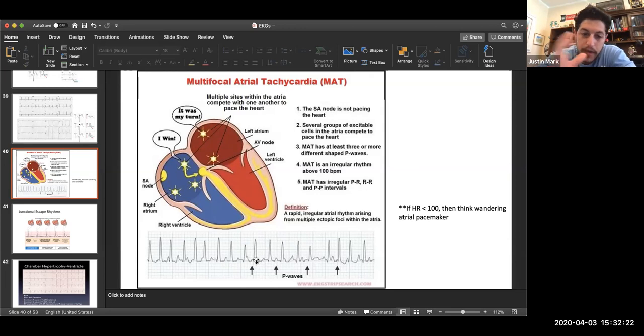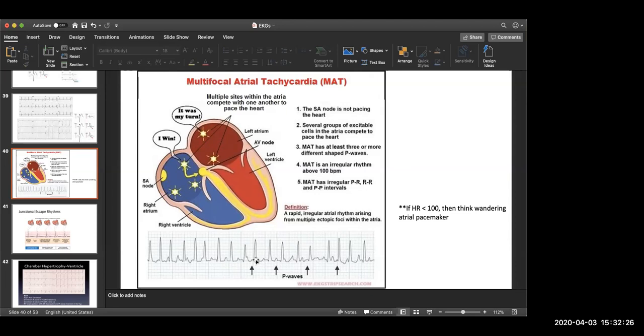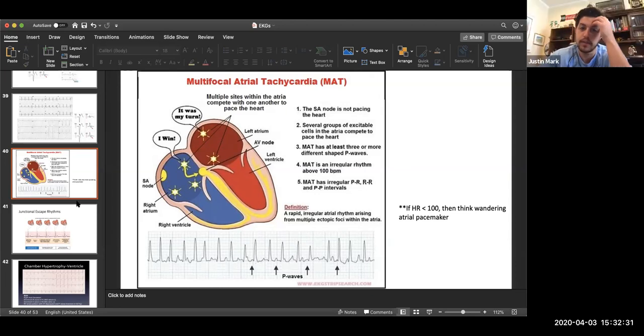And sometimes you have the P waves on the T waves and things get really crazy. It gets nuts. But I just decided to focus on the more common type stuff, nothing that's super crazy.